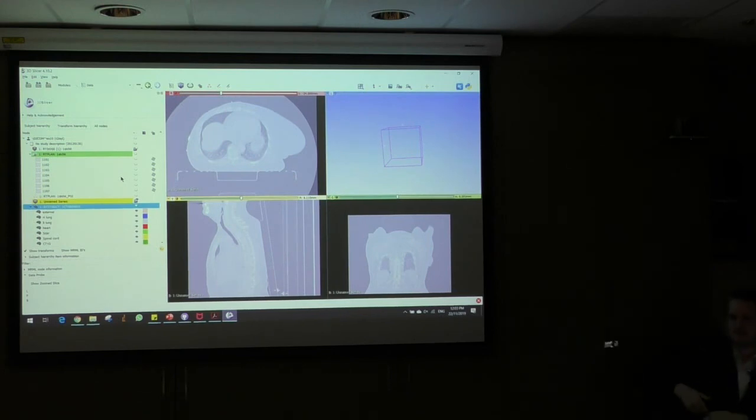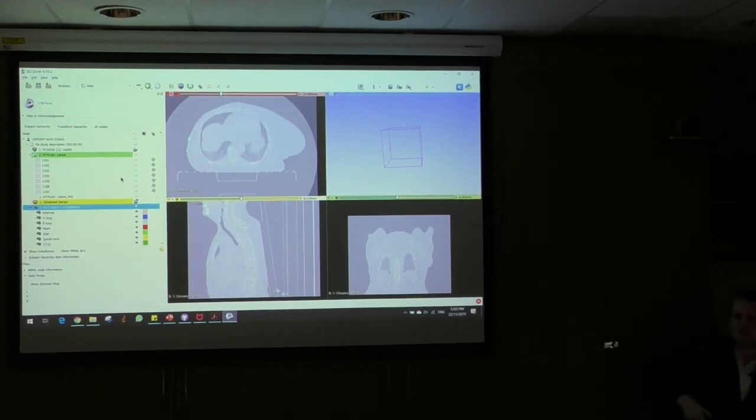So, for instance, a rib here, similar to the rib down here. It will separate those two into different segmentations. So the merge and build allows those two to more or less come together, and you then create your segmentation of the entire rib function, basically.